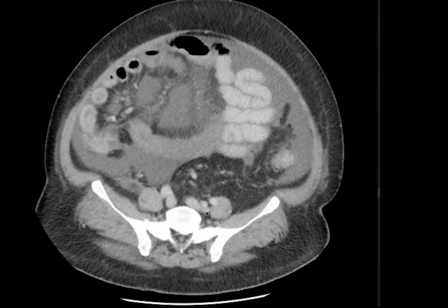If you let me have control back, I have a specific question. So if I stop in this loop here, this is the ileal loop you were describing. Can you try and describe this for me once again?